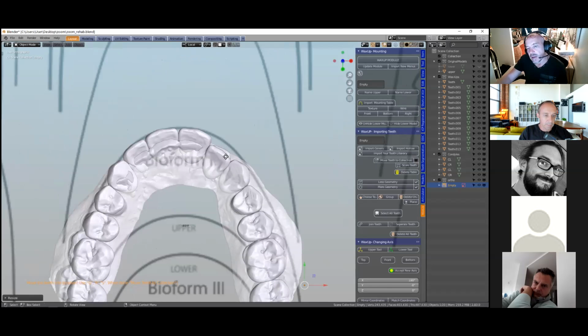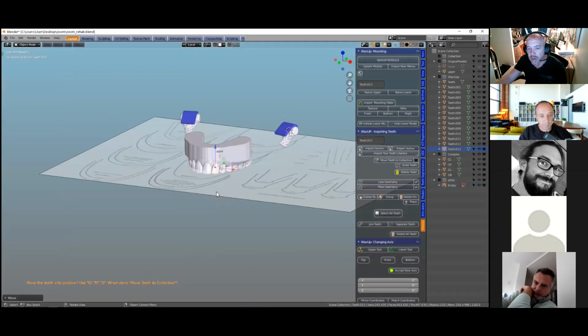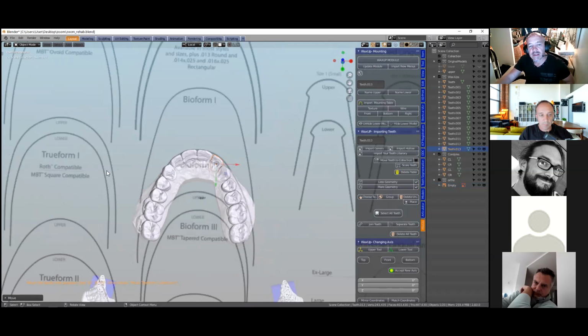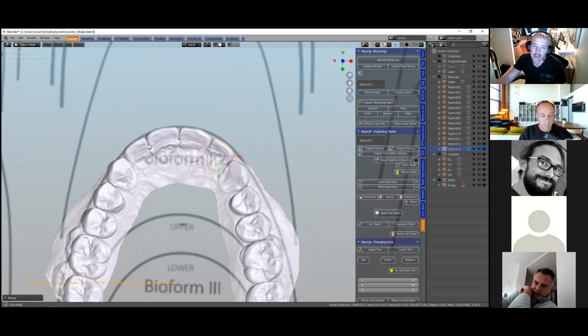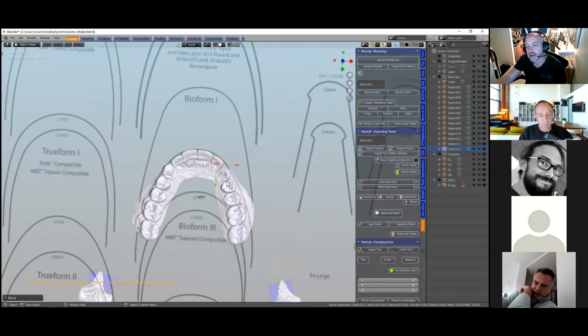So in your diagnostic wax up, you can just simply bring it out to that line like that, and we will then know that the tooth is in the correct way, assuming all of these are natural teeth now, except for that lateral, and you want to make a veneer or 2 laterals. So this is very helpful for us then to place this over there and this over there, so we can get them nicely lined in the arch.